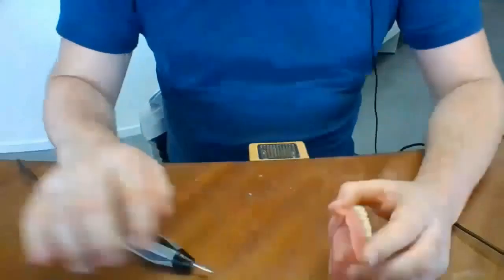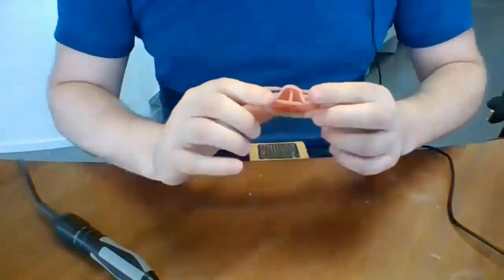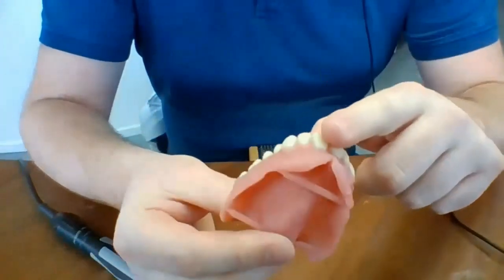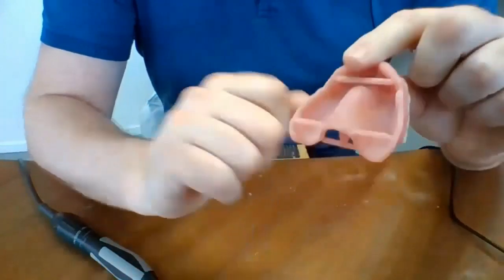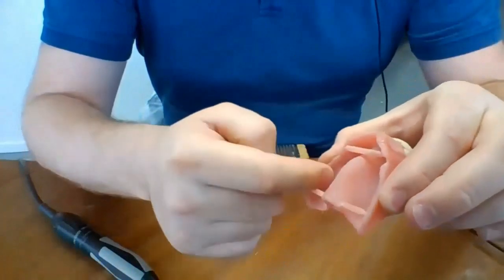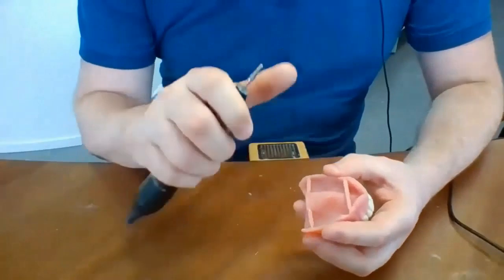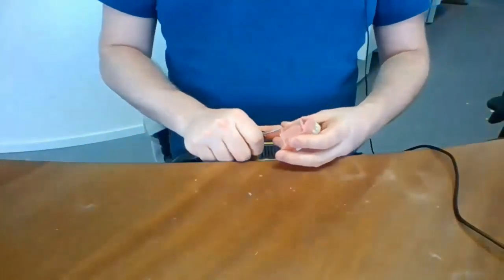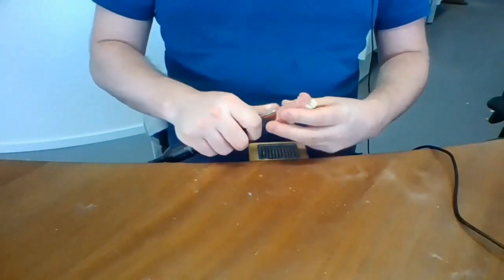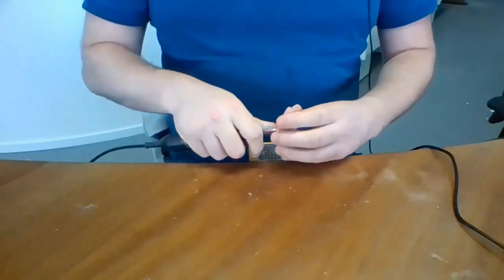And here you can see that Lars has a printed denture with these support bars. The MFH printed tooth arch is already in place, bonded with the Denture 3D Plus materials. And there you can see these support bars now with the small tips at the connecting areas and a little bit bigger in the middle. So you just use your hard carbide tool and very easily cut them off at two sides. So it's very easy and quick to do that.